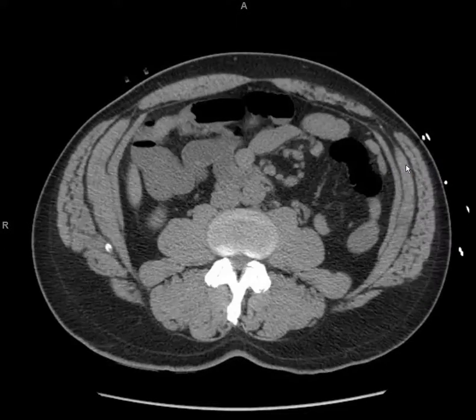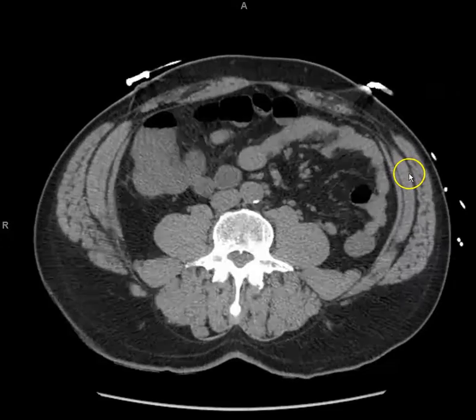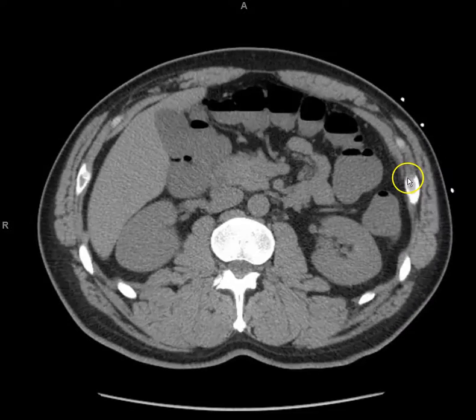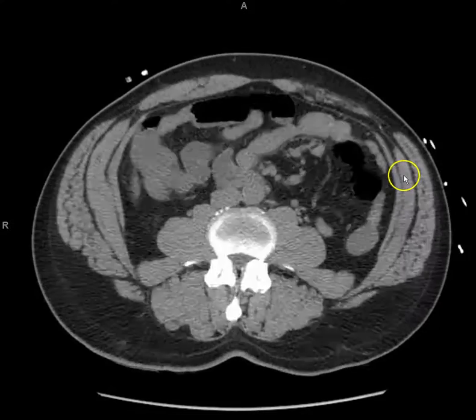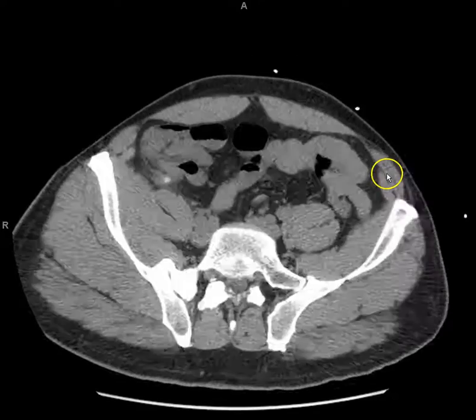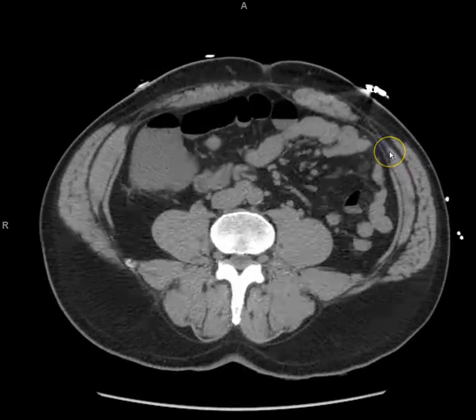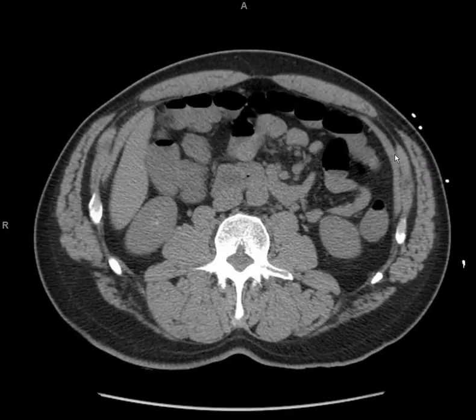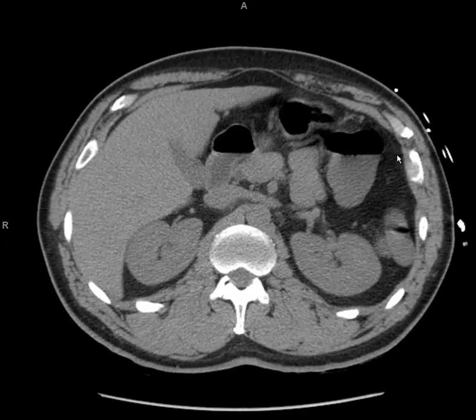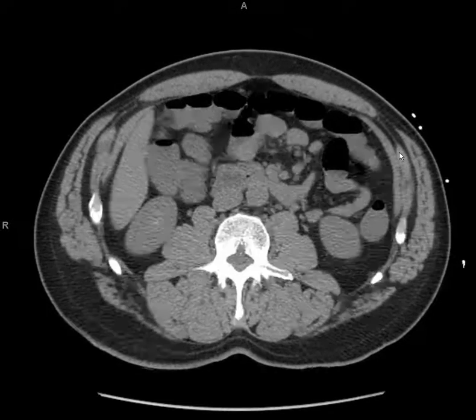We'll look at what looks to be over here. Looking for a good view of it. It's a pretty round shaped person. I've noticed it's really round. Not the back. He's pretty fit.